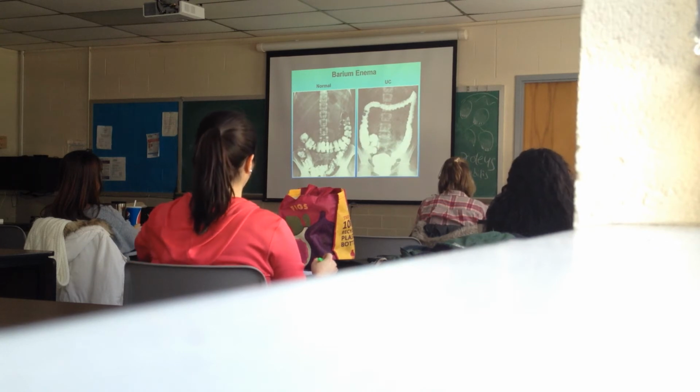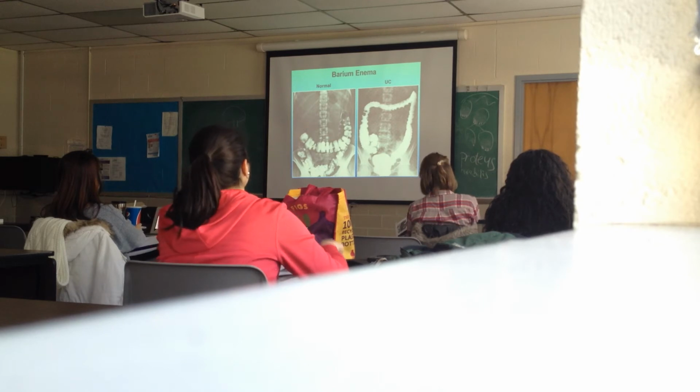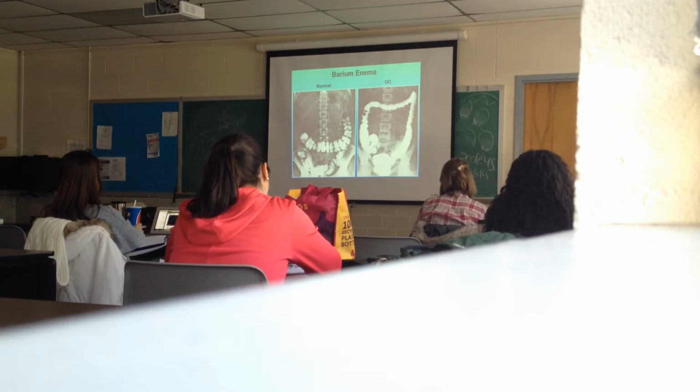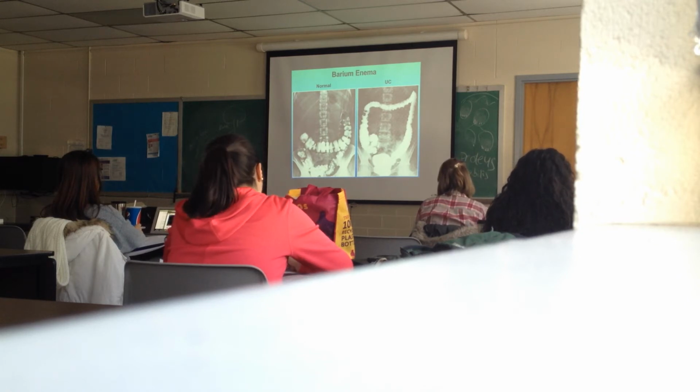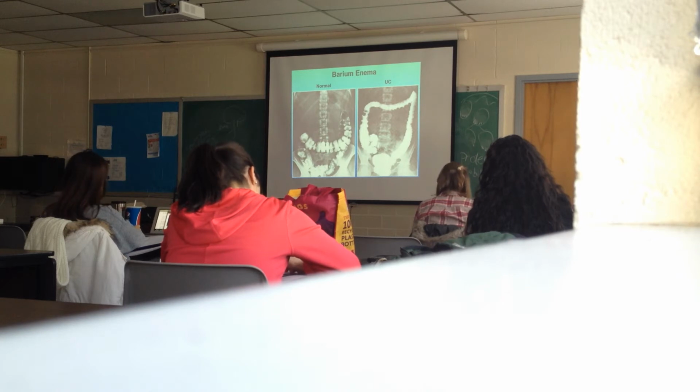Okay, we're looking at the lower GI tract. We'll do this in the context of inflammatory bowel disease. You should just generally be able to identify the different portions of the lower GI tract by radiographic barium enema study. So, what's this part? The cecum is over here. Just proximal is the terminal ileum and that little stricture.